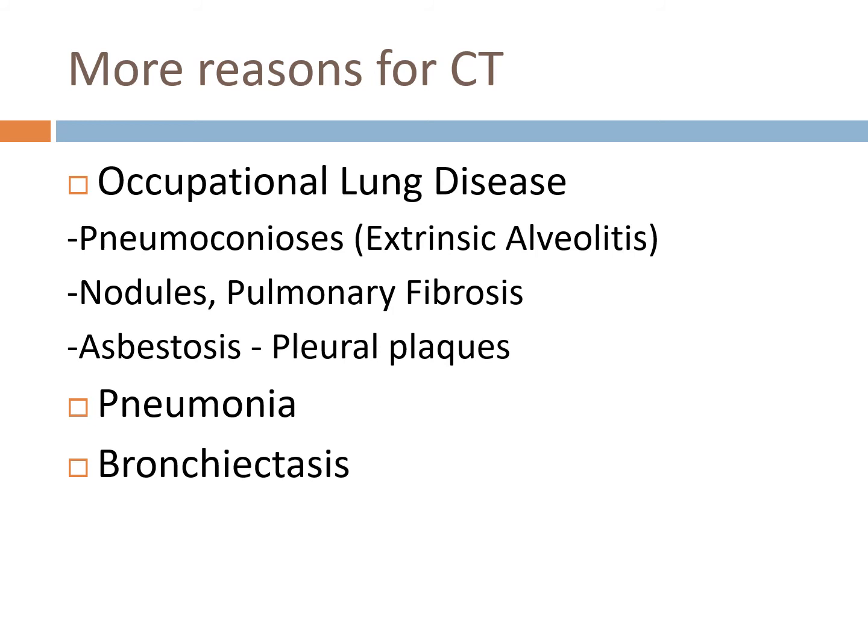We're looking at different conditions: pneumoconiosis, nodules, pulmonary fibrosis, asbestos. You can see pleural plaques, again pneumonia and bronchiectasis.